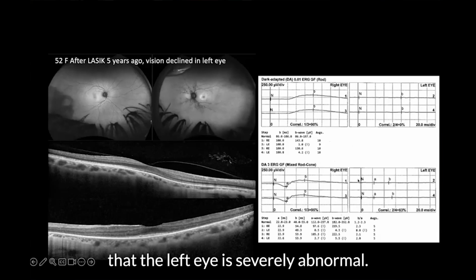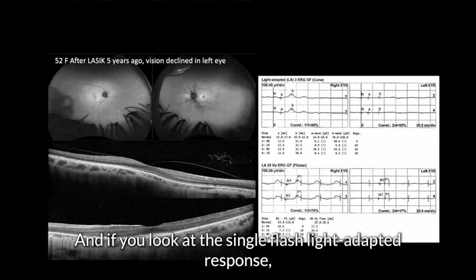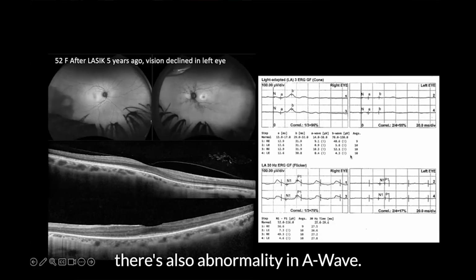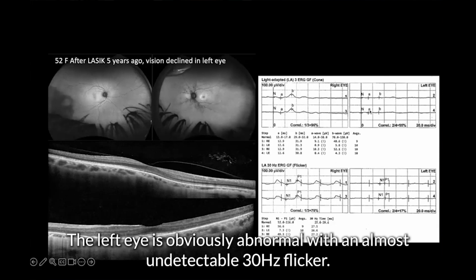The left eye is severely abnormal. And if you look at the single flash light adapted response, there's also abnormality in the A wave. So that normal looking eye is, in fact, abnormal. The left eye is obviously abnormal with almost undetectable 30 Hertz flicker.